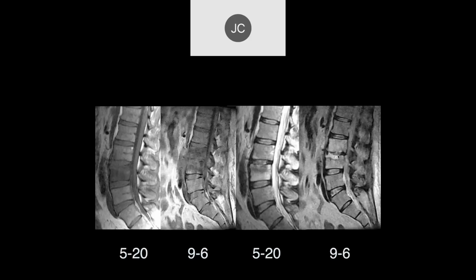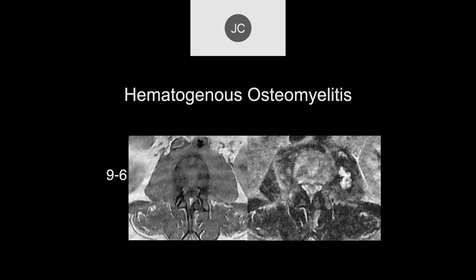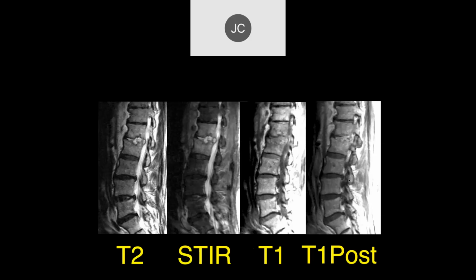But this again is discitis. This starts at a little later stage than the previous one. We have more osteomyelitis, but it's already affected the end plate. So the disc is probably already going to be involved at this stage, though subtly, and then it rapidly progresses once it gets into the disc. And on the axial images, you can get psoas abscesses or paravertebral abscesses associated with these.